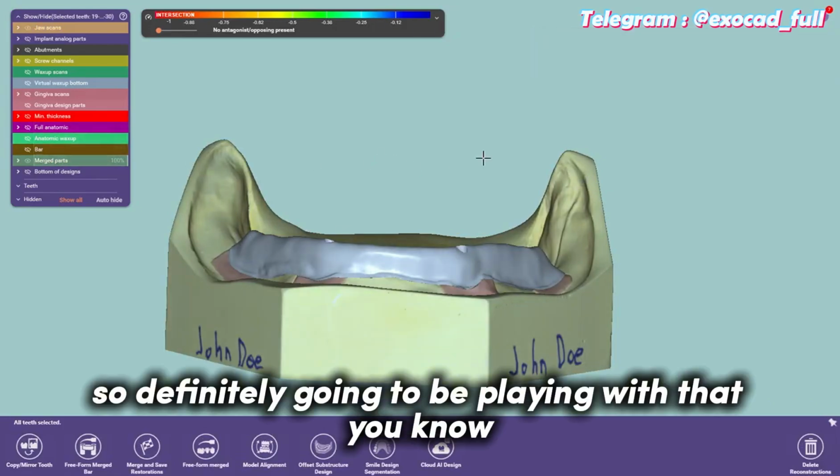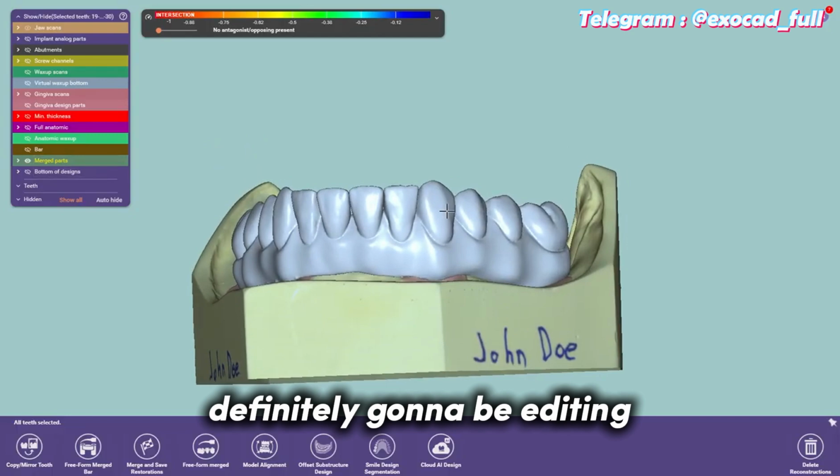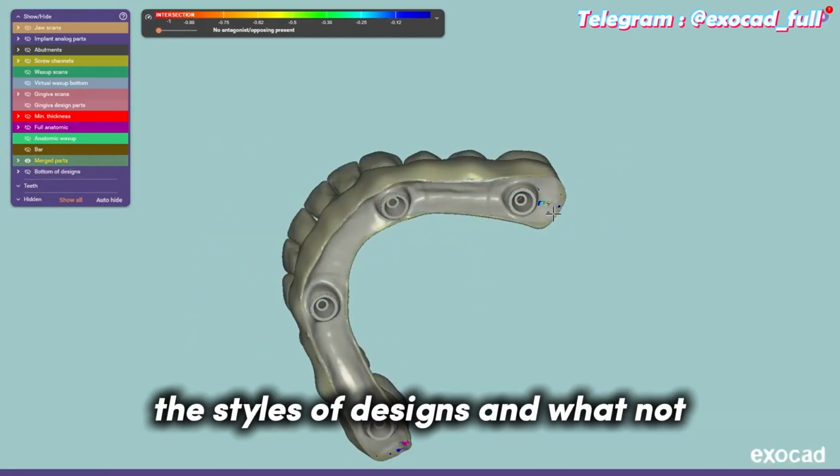All right. So definitely going to be playing with that. Definitely going to be editing the styles of designs and whatnot.